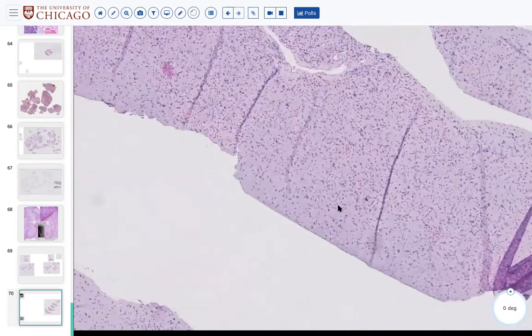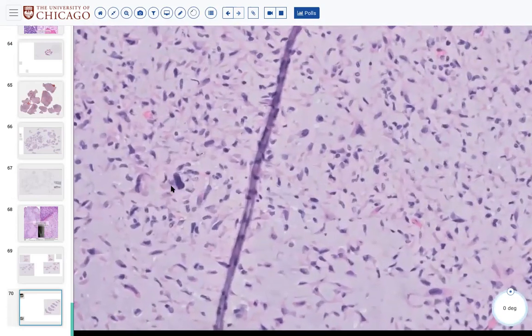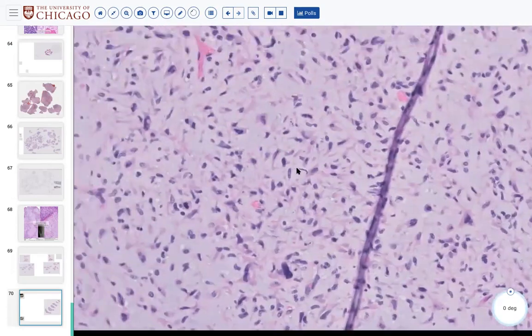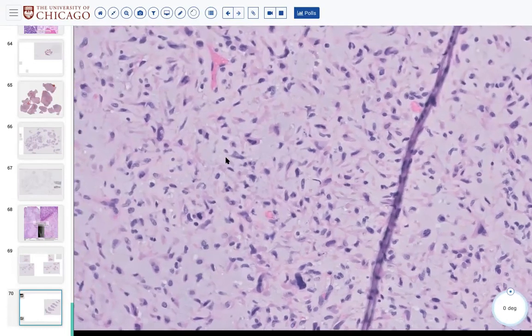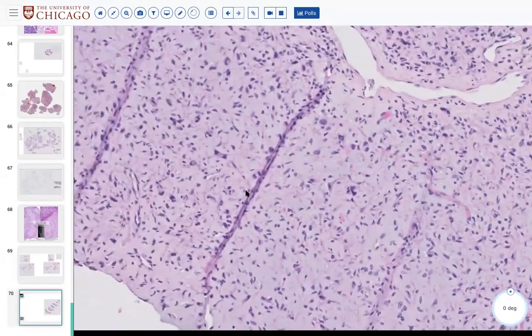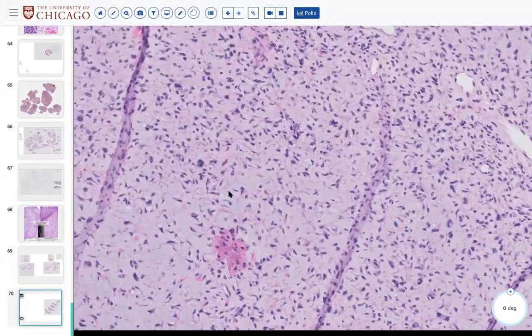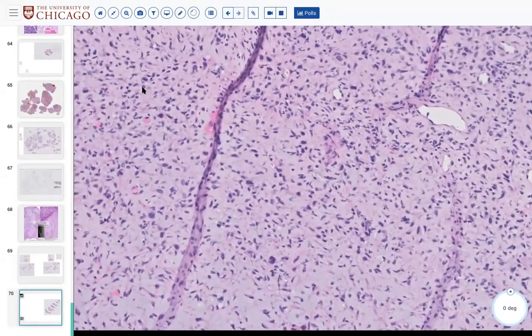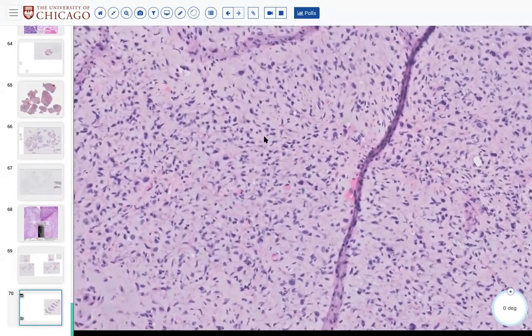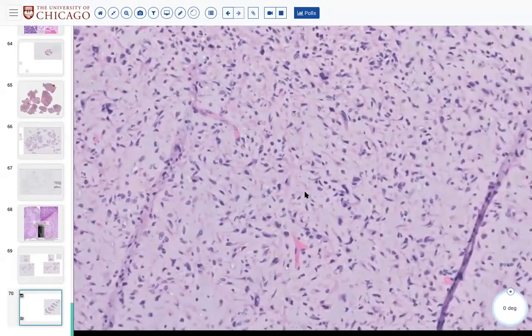All right, type in the chat if you think benign or malignant. I don't even care what type of diagnosis, just tell me if you think benign or malignant. Do we see any mitoses? I'm not able to see any mitosis to confirm malignancy. I thought we passed one. Did we pass one a ways back? Looked like they were pulling apart.